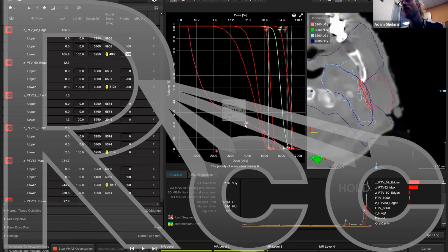So if I can see it starting to go above the parotid objective, I can't quite get it. You can move these anchor constraints up, and it starts slowly moving this shoulder back up. Maybe not the best way of showing this because I optimized and I showed some things that I don't really want you to do on that side. But that's the idea: if you've anchored your organs at risk in place and you can't quite get your PTV shoulder to where you want it to go, you can relax those anchor constraints further up. Okay, I'll bring these back down to where they were.